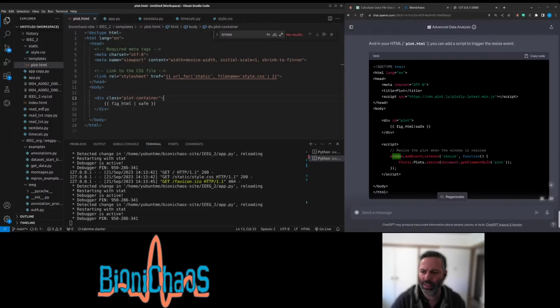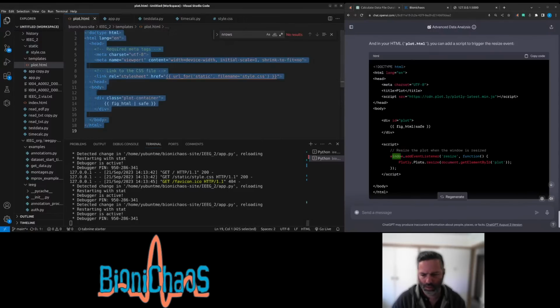Do we actually need this JSON script for Plotly? It's been working without it. Do I need changes to the following code?